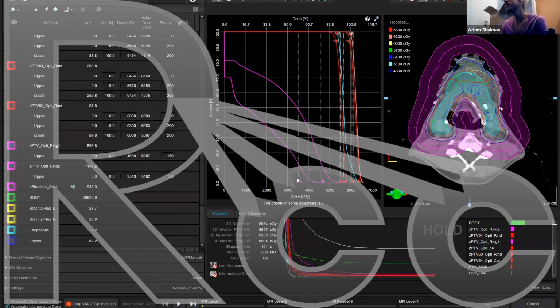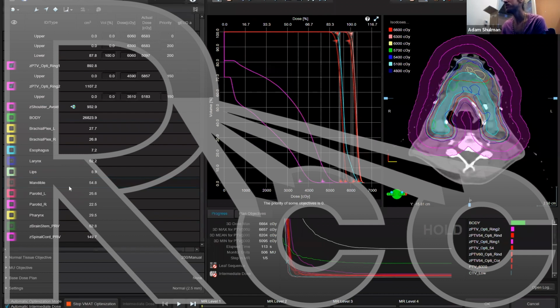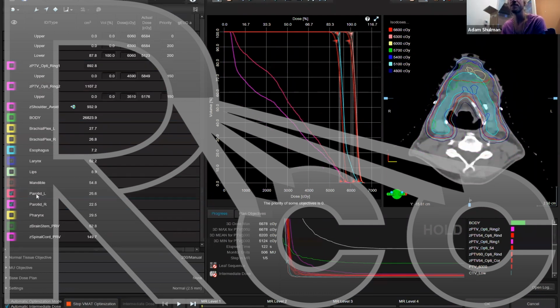They should sort of look like this by the end of your optimization. And so now we will start adding organs at risk slowly, one at a time. I'll start with my most important organs at risk, my left and right parotids. I'm going to turn off my rings right now so you can see a little bit better.